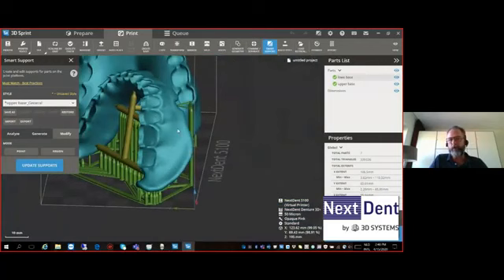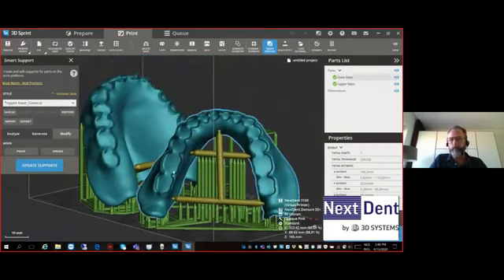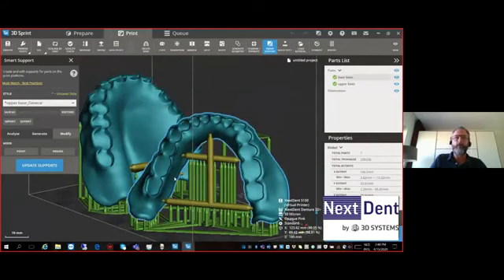Here, where it's also critical that we have a perfect fit of the arch, we want to leave occlusion, articulation, and everything that was designed by Germen intact. So we have no supports here. We have the support bars, and now we can just send it to the actual printer.